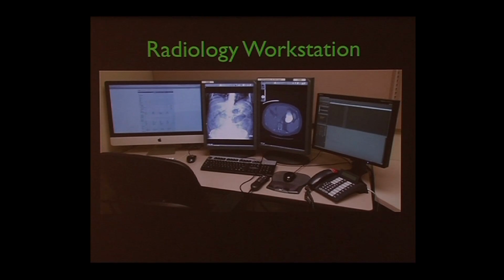So here, I took this last week with my iPhone. This is the workstation I was working on last week and also yesterday and the day before. It consists of 2 monitors that I can see images. I can put multiple images up there. I can put a new exam and an old exam. I can put different kinds of exams on those screens.